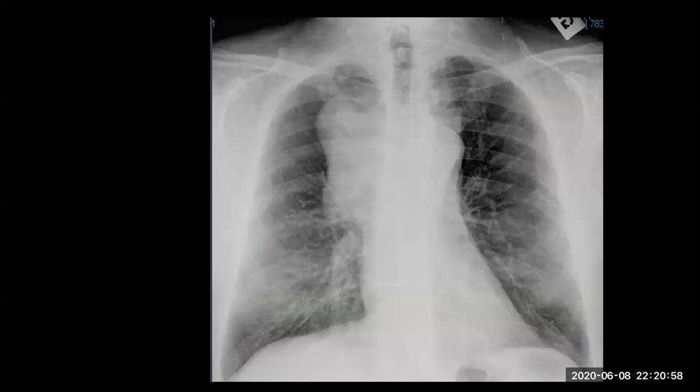In phase, out of phase. Yes, for adrenal adenoma you do in phase, out of phase. And if it is an adenoma, it will be suppressed in the out of phase. Also in thymic hyperplasia, we do in phase, out of phase, and it will suppress in the out of phase. And this is the classic for hyperplasia.